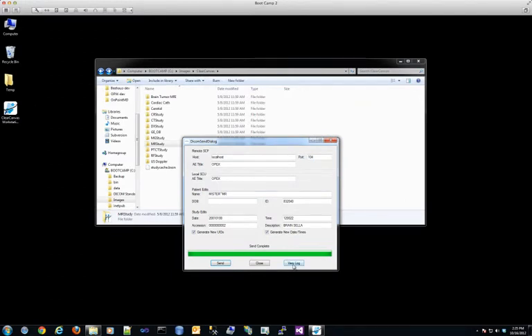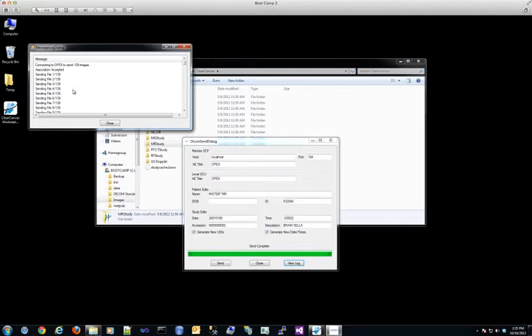The other thing is if something goes wrong, it does keep track of a log which you can look at. This can be used to diagnose and troubleshoot problems. It'll show different situations. For example, if the SCP is unreachable because of a network issue, or maybe it's rejecting the association because of the AE titles, you'll see that here so you can troubleshoot exactly what's going wrong.